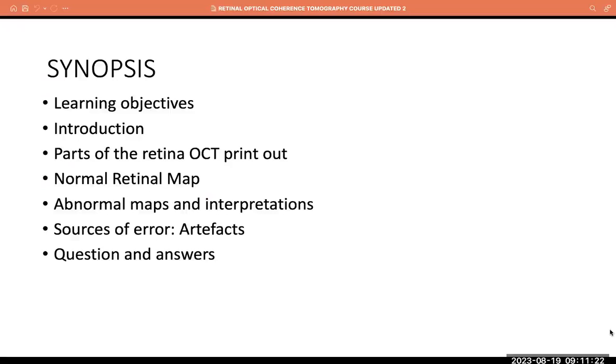Everyone on this course should be able to describe what the normal retinal OCT looks like and understand the layers and their significance, such that if faced with a pathology, you can match your theory with what you expect from the OCT, and also know how the OCT can be used in disease monitoring.